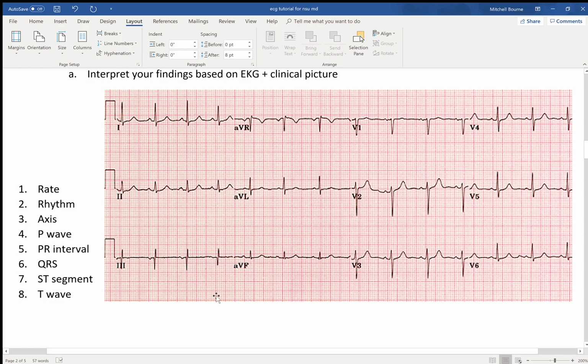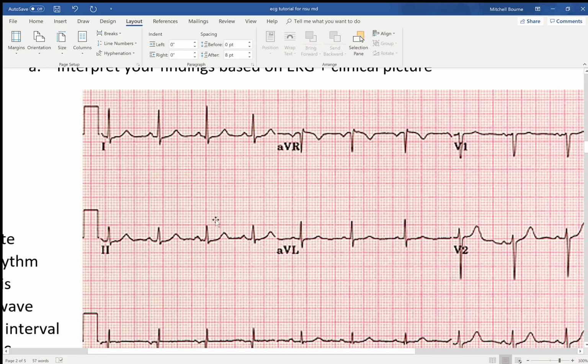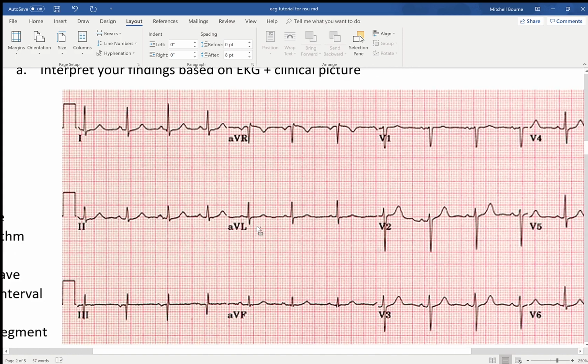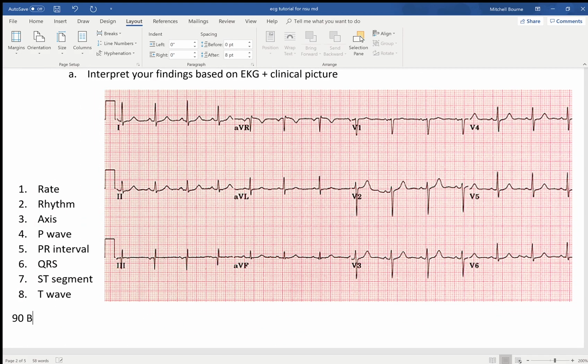So in class, we learned this method where you start with a QRS complex that starts on a thick line. So here's one right here. So we zoom in, and then we're going to start counting big boxes until we see the next QRS. So here's the start. 300, 150, 100, just past it. So, and this would be 75. So this is 100, this is 75. This is roughly 90, okay? So this is roughly 90 beats per minute, which is normal. Our range of normal, there's normal. Roughly 90 beats per minute.